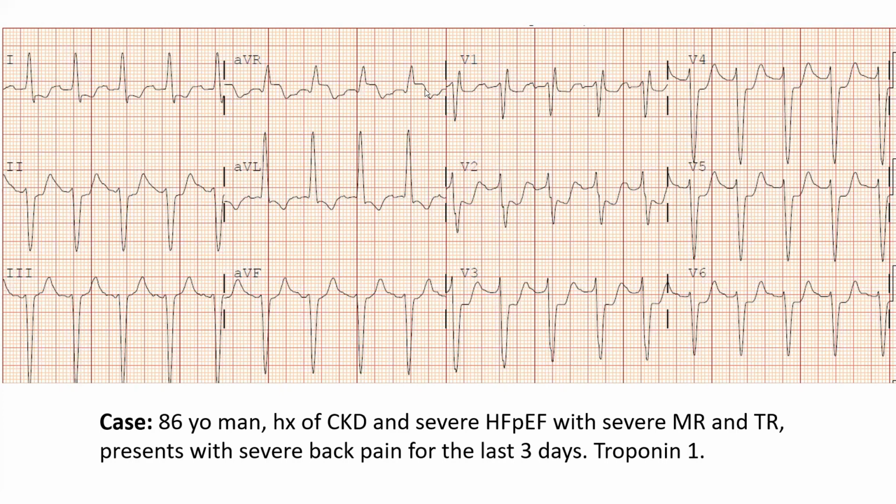And you have ST elevation in lead AVR. So what you answered in the chat box is correct. This is suggestive of left main disease. Diffuse ST depression with ST elevation in leads AVR and/or V1 would be suggestive, in general, of the pattern of left main and/or severe proximal LAD and/or severe 3-vessel disease. Now, why does this happen?